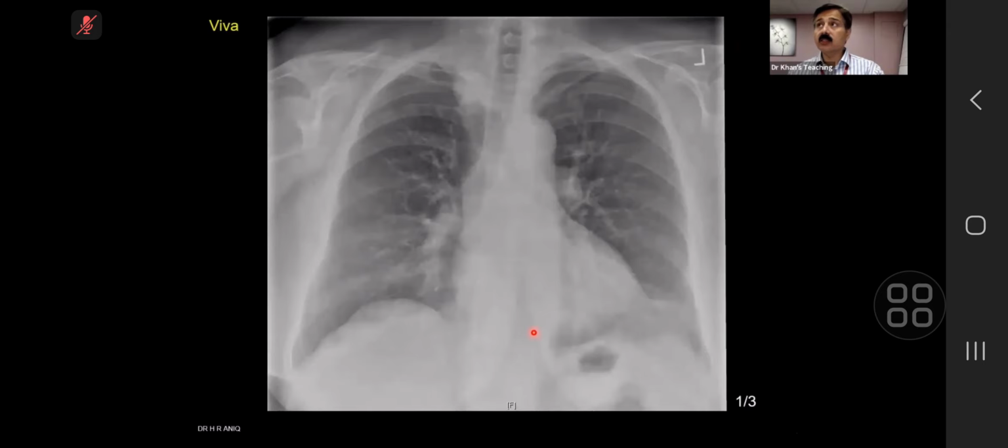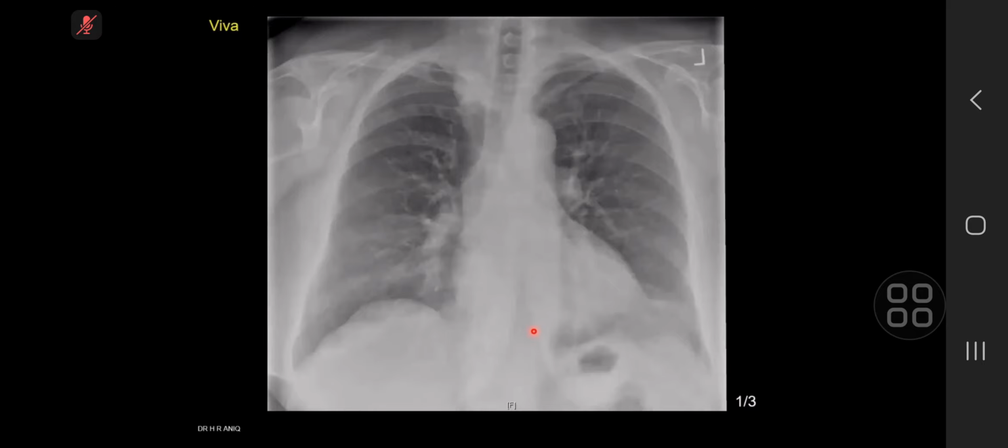This is your last case, and then number 3 should be ready. This is also a classical 2B film, absolute classical. Again, a frontal chest radiograph of an adult patient. There's some atelectasis in the left lower zone, otherwise the lungs appear clear.